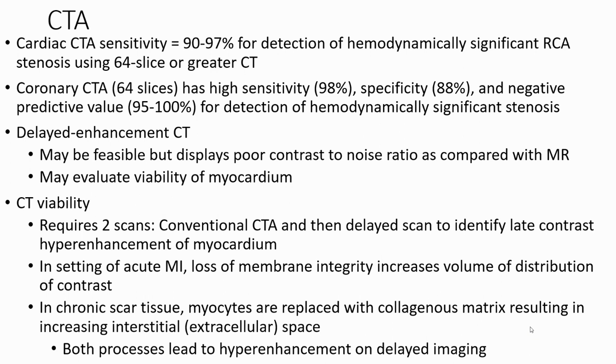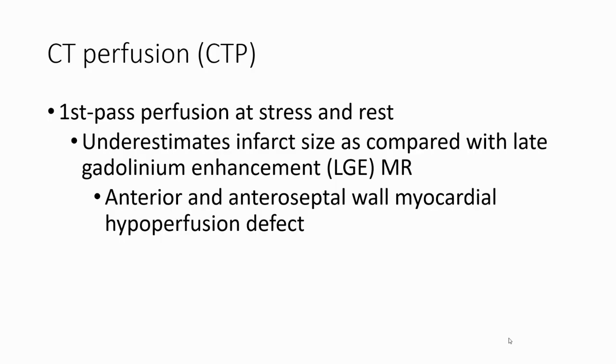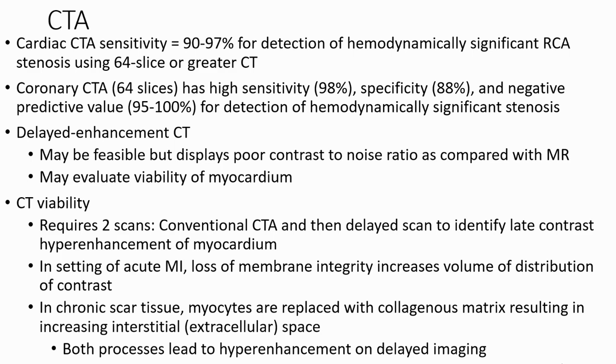In chronic scar tissue, there is collagenous matrix resulting in increased interstitial space. Both processes lead to hyperenhanced or delayed images.